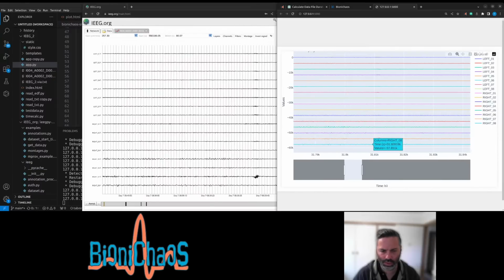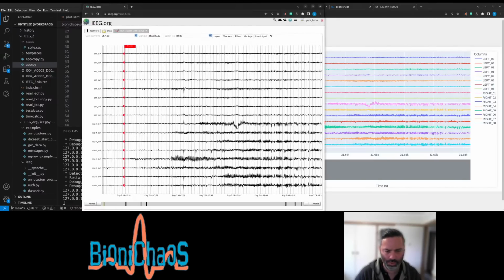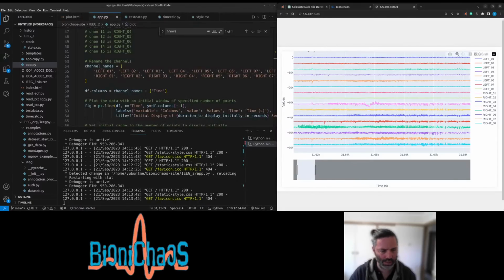It's this bit here. There's nothing remarkable. So we're displaying this seizure at the moment. Okay, let's keep going from here.